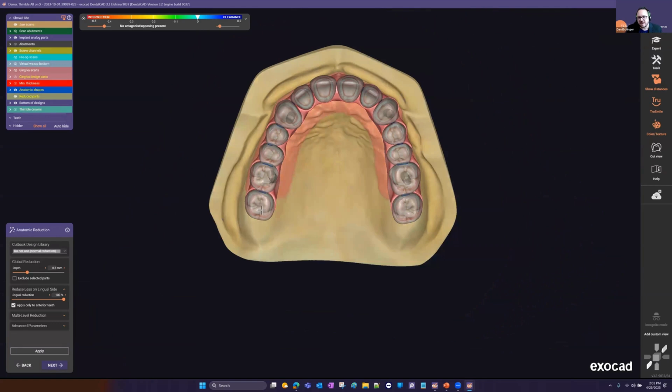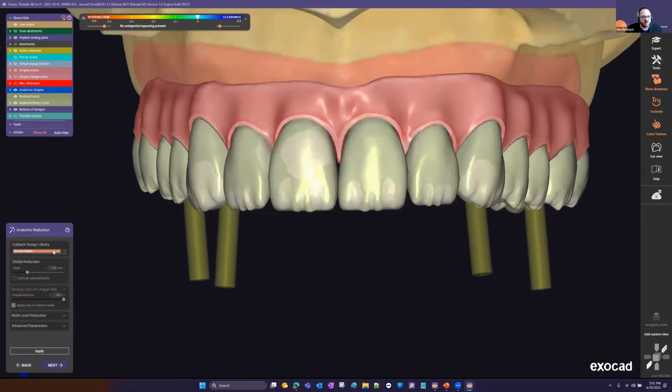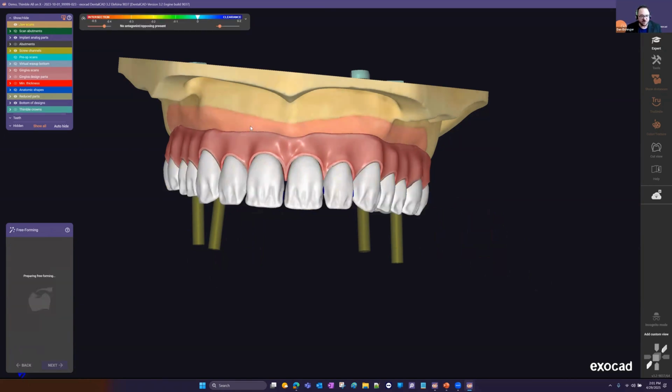And then since this was set up as copings again, now I can do a facial cutback. Or I said facial, but that's your incisal. Maybe you want to do the facial with more of a dramatic cutback there. So right now, with the cutback libraries and doing the gingiva cutback, and the thimble preps, you have all kinds of options that you were able to see and learn today. Hopefully you all have gained something from this demonstration.